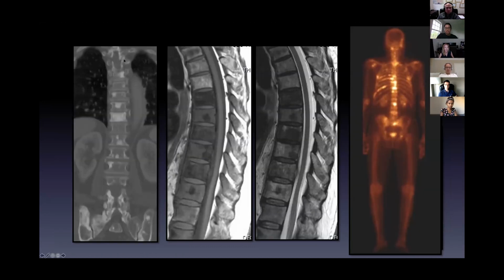This is prostate cancer, very typical look of a blastic metastasis, dense on this coronal CT, multiple bodies involved. Important thing on MRI, just like cement. When you're looking at an MRI, what makes the brightness or darkness is moving protons. That's what we're measuring. So if you have a rock or cement, you have no protons, and so it's going to be dark on everything.